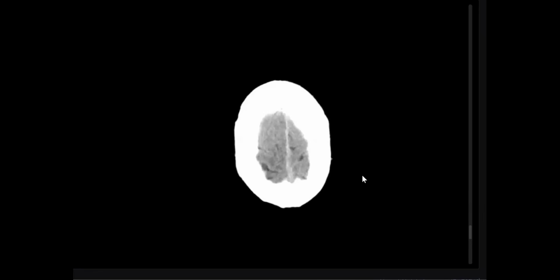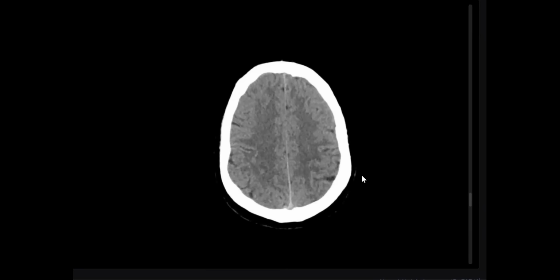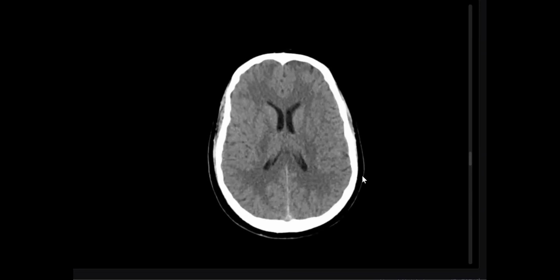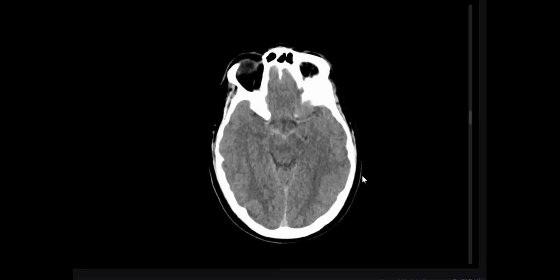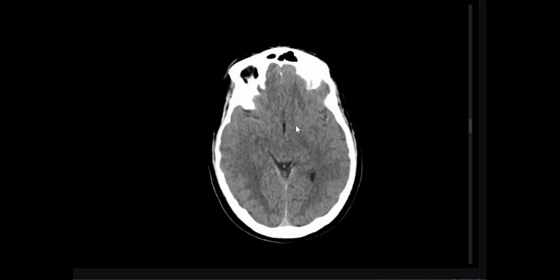Okay, so cortical sulci look fine, so no subarachnoid above. No subarachnoid smearing the sulci, which is usually post-traumatic. Look at the basal cisterns. You may find subarachnoid related to the aneurysm rupture. If not, look at a specific area for a subarachnoid.